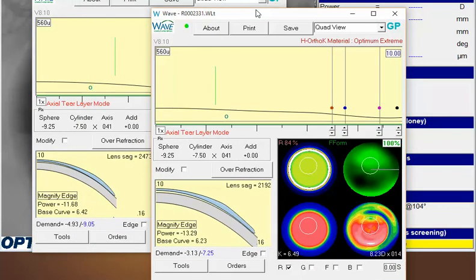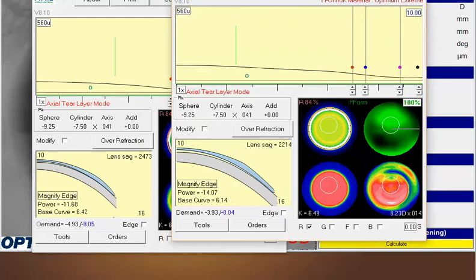I did a similar thing over here on a little smaller diameter, so I clicked over the RSIM, I got around 620, and you can go steeper if you want. Bring it even more down, that gives you your 619, and if you want to go even steeper, you can do that. I left the lens a little bit larger to try to incorporate a little larger landing zone, and I think using your 11mm would be fine.